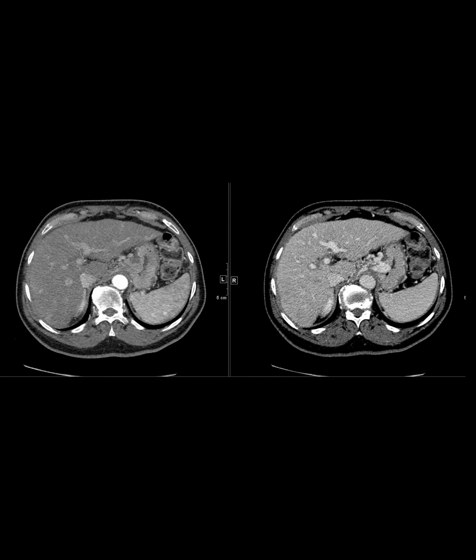And here, to be honest, they knew that this was multifocal HCC, but they felt like getting a new liver was the patient's best chance of survival. And since we didn't call it based on OPTN criteria, these are not HCCs. So he got a liver, or she got a liver, I'm not sure.